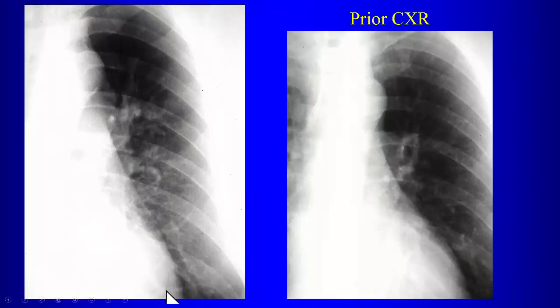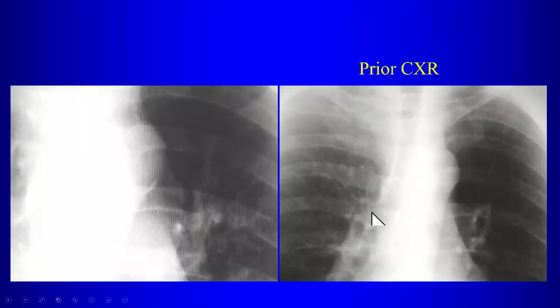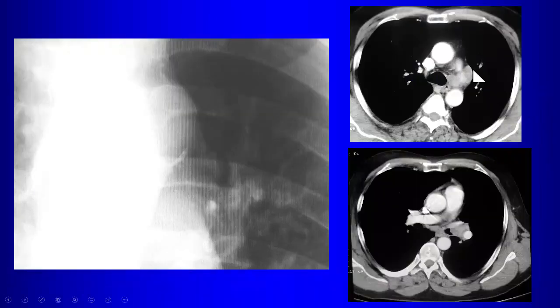So when we compare this X-ray to the prior chest radiograph, what do we notice? Sure. Here's a very nice AP window. Look over here. There's some soft tissue now with a contour extending out from the aortopulmonary window. Prior chest X-ray, current chest X-ray. It's subtle, but it belongs on your checklist of things that you look at. Lymphadenopathy, the patient has a squamous cell cancer in the left upper lobe bronchus here with AP window lymphadenopathy. That's what this is.